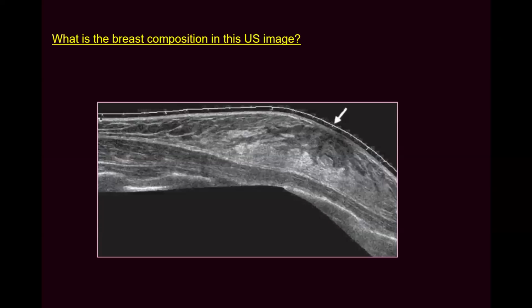And what is the composition of this? Heterogeneous background echotexture, fat. Why is it heterogeneous? This hypoechoic region represents interposed fat. No, so this is the gland. So it is homogeneous background echotexture, fibroglandular. Yes, this is homogeneous. If you look here, the whole area is hypo and the remaining is hyper, not intermixed together. Yes, this is homogeneous background.